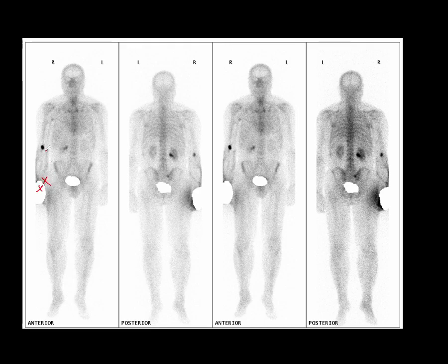So what's this? Well, this is activity within an epitrochlear lymph node, and this is activity within an axillary lymph node. Now, it's likely that you might ask for a spot view just to make sure this is projected away from the humerus, so it's unlikely you'd mistake this for a distal humeral metastasis.